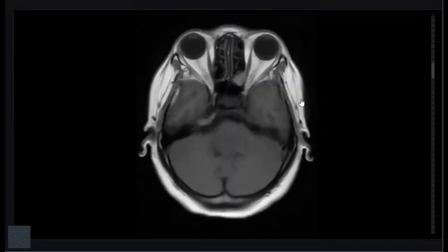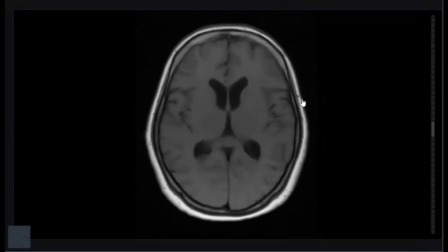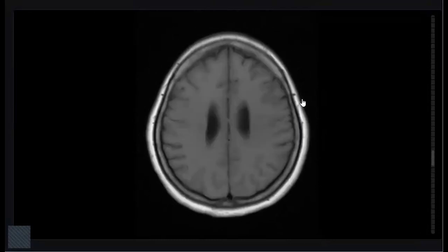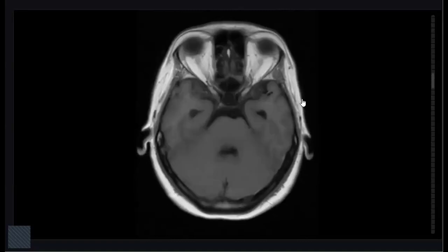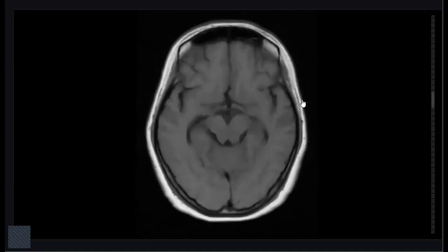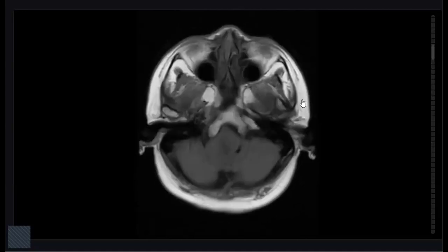So I could not see any obvious pathology on these T1 weighted images. Now I am looking for my review areas. There is no evidence of... Please don't use this phrase. Don't say 'I couldn't see any obvious pathology', because the pathology will be present and you are telling the reverse, that there is no pathology. Yes, yes, I'm looking, and then you can tell the negatives.